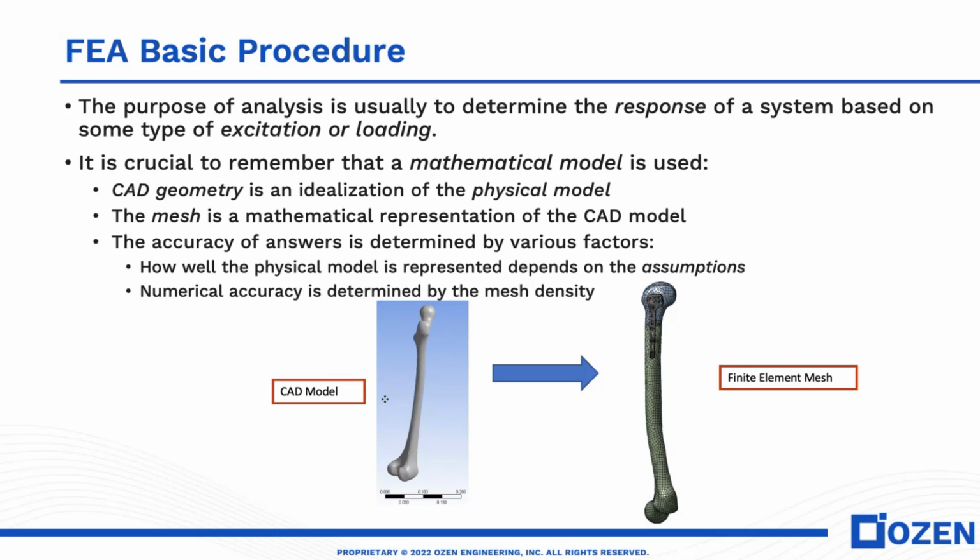Now I'm jumping into the other topic, which is the finite element analysis. As you know, with a finite element analysis, you start out with a CAD geometry. In this specific case, we start out with the bone geometry. And this bone geometry for each patient, in the case of patient-specific data, can be scanned and brought into these musculoskeletal models.